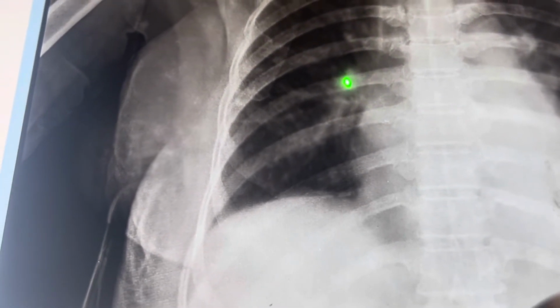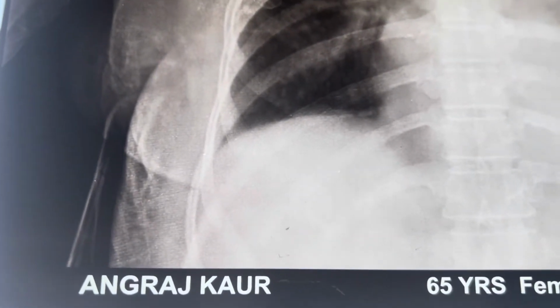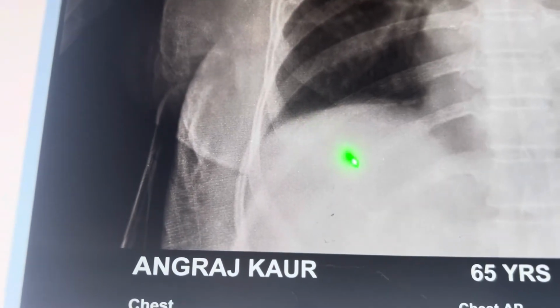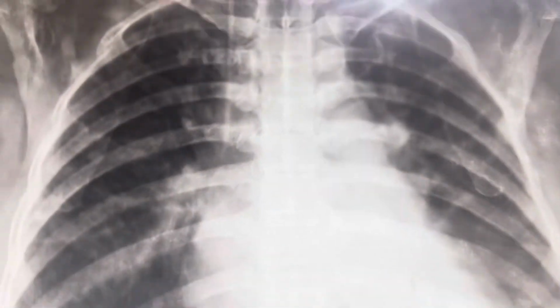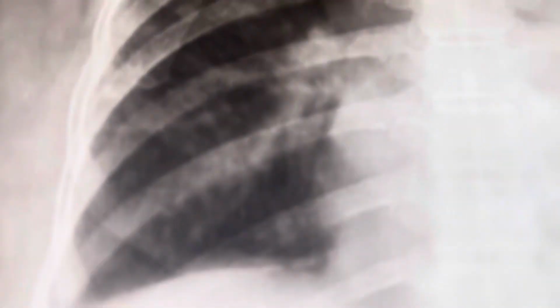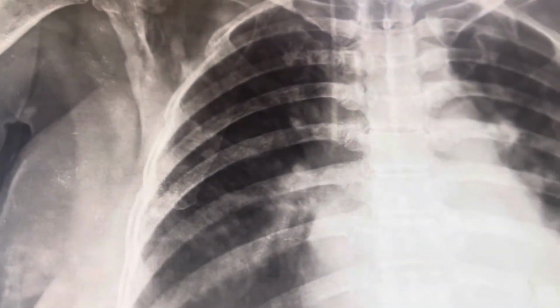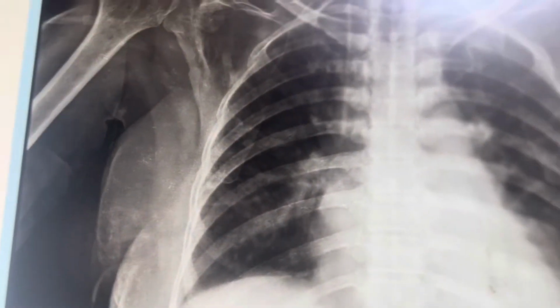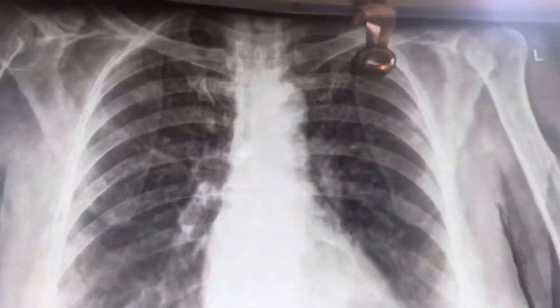And also we can note the shadow of the ribs, the shadow of the lung, the black colored area, and the shadow of the diaphragm. Now, why are we taking the anterior-posterior view? If the patient is not able to stand in front of the x-ray film, if the patient is on the bed, in the supine position, or dealing with some kind of problem, at that time we take the anterior-posterior view for the chest x-ray. Otherwise, most of the time, we take the posterior-anterior view.